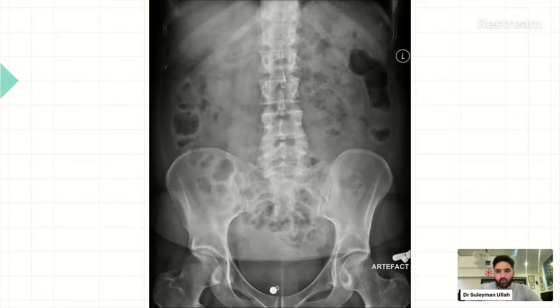Okay. So you're all right. It's a trick question. There is nothing to spot on this X-ray. The only thing you would be concerned, well, we can go into that later actually, but you wouldn't usually see any findings on an abdominal X-ray for acute appendicitis, apart from in one scenario, which we'll go into later. Okay, but yeah, well done. I'll treat that as you all got the question right.